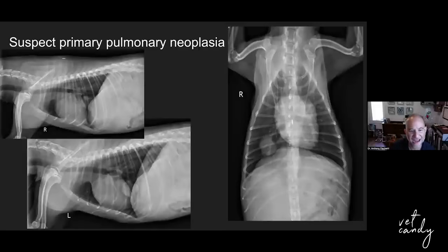We've got to talk about NAG lesions, right? Big old soft tissue things. Look at how perfectly round this thing is. We call these NAG lesions: neoplasia, abscess, or granuloma. Basically, well-margined, discrete, often round masses in the lungs. So it can be associated with neoplasia, abscess, or granuloma.